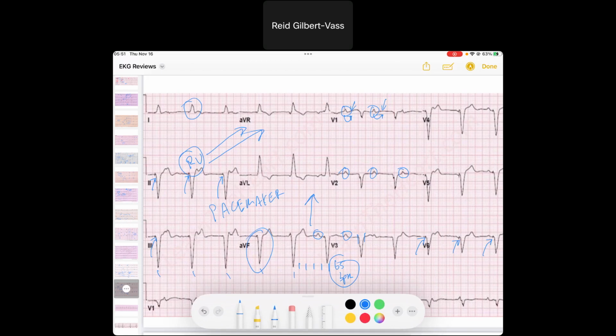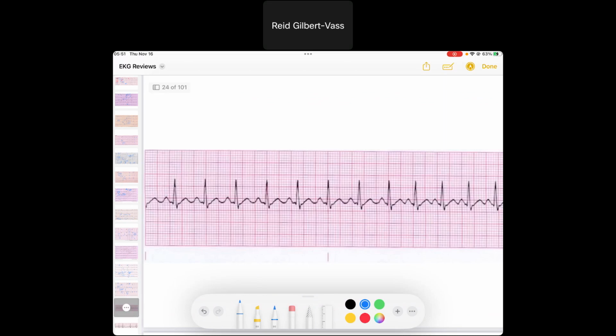Pacemakers have an atrial lead and a ventricular lead. So if this individual creates a P wave, which he did on his own, the pacemaker should recognize that and squeeze the ventricles so that we have some coordination, but it doesn't. So maybe this person needs to go see his cardiologist and determine what's wrong with the pacemaker.